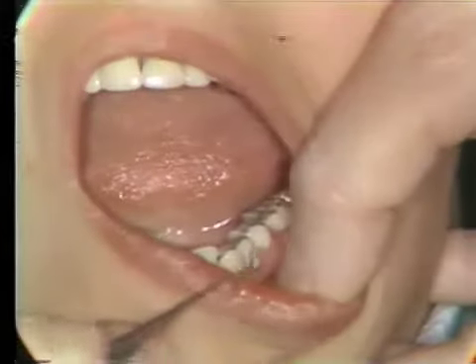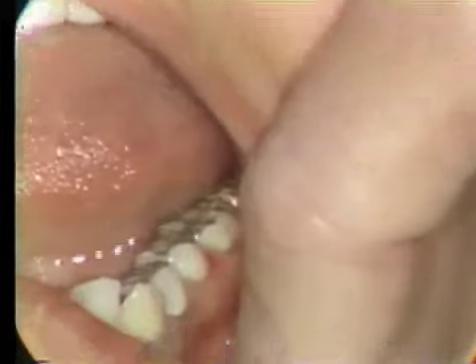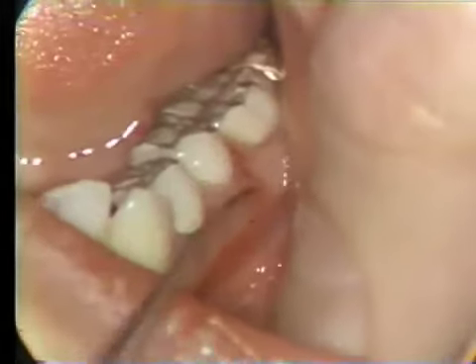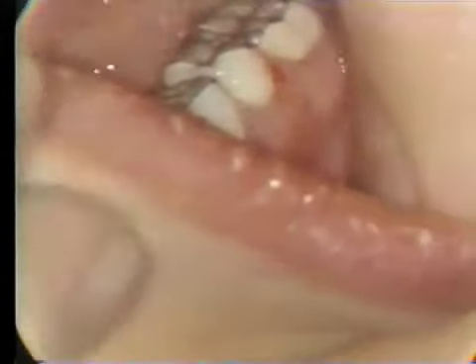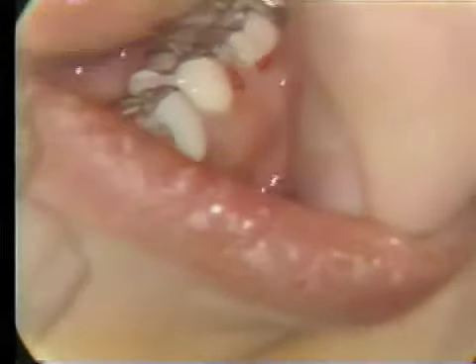Then what we would like to do now is to contour the restorations and the crowns and the porcelain to give a good gingival environment here. You can see here we've got quite a bit of a bulge in this area. This one's not too bad. This contour we would like to have. The under contour is better for the gingival tissue than an over contour. So this is why we have it returned in the biscuit bake.